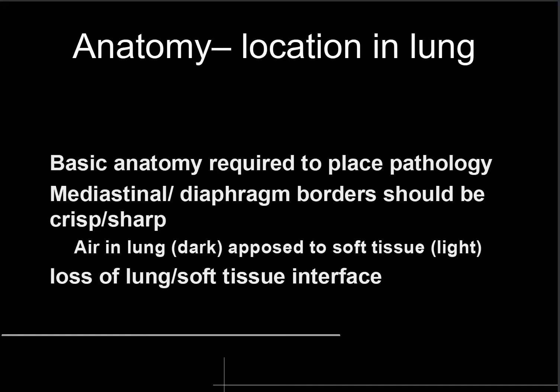The heart border isn't going to look as sharp because the lung sitting against it is full of pathology. So you lose your lung soft tissue interface. And where that interface is lost will tell you where the pathology is. Let me give you some examples.